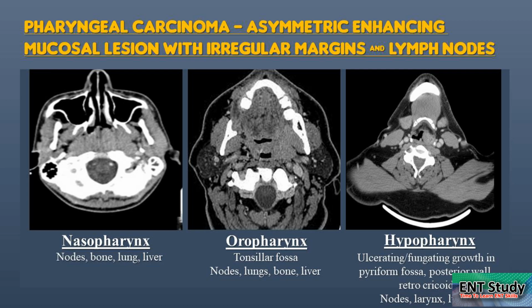And then when you do a CT scan of the neck, you see this mass sitting usually in the tonsillar fossa on one side. Again, it's the comparison of symmetry which is important. The percentage narrowing of the aerodigestive tract is important. Erosions are important. Preservation of adjacent fat is important, and even more important are these vessels.